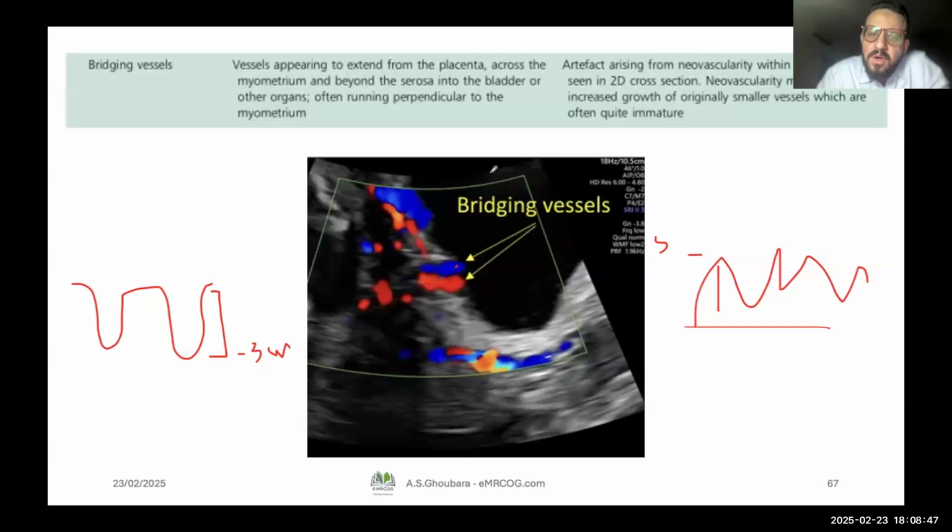Color mapping gives you an idea, like a mapping of the vessels all around this box inside. Again, direction and velocity. Is this clear? Good. Pulsed wave Doppler is important in obstetrics in small for age, like the uterine artery and umbilical artery pulsatility index, resistive index, and middle cerebral artery. All these indices, we get this calculation from using the pulsed wave Doppler.